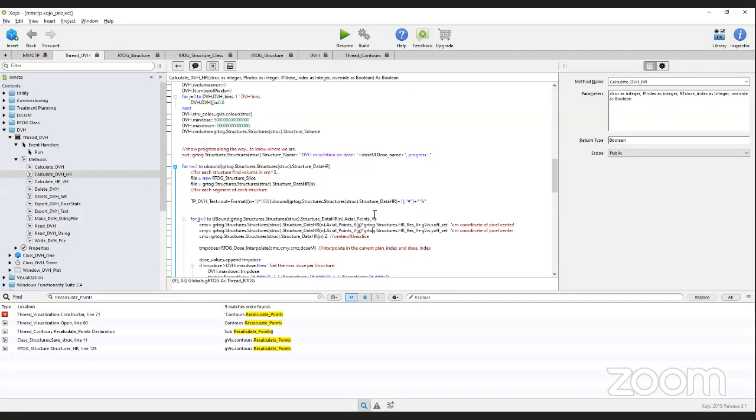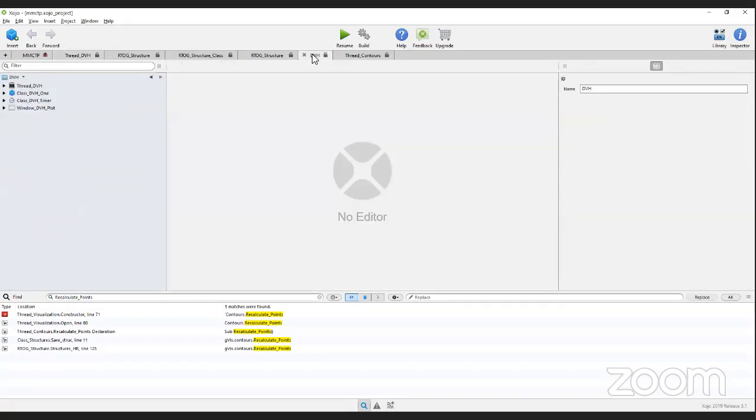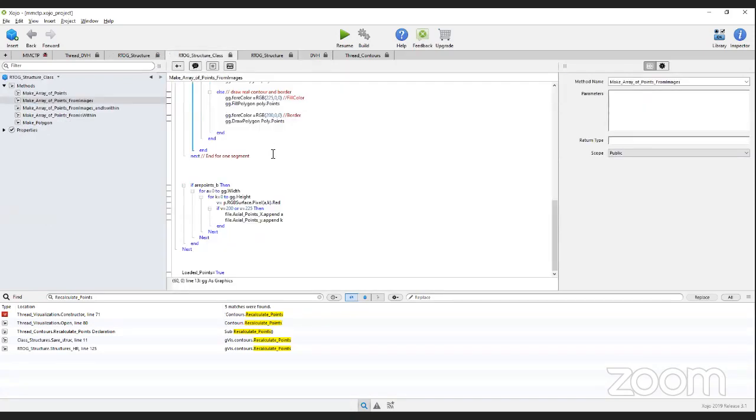Now we want to calculate at a smaller level. So we have to accept that there is going to be interpolation. Right. We have to accept whatever errors are generated. That's all. So I was mentioning using the images to calculate the DVH points, and I just want to show you how that's done.